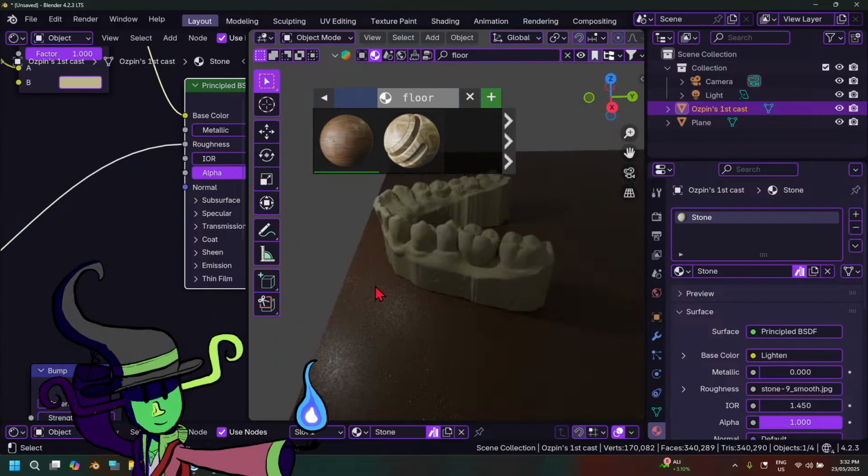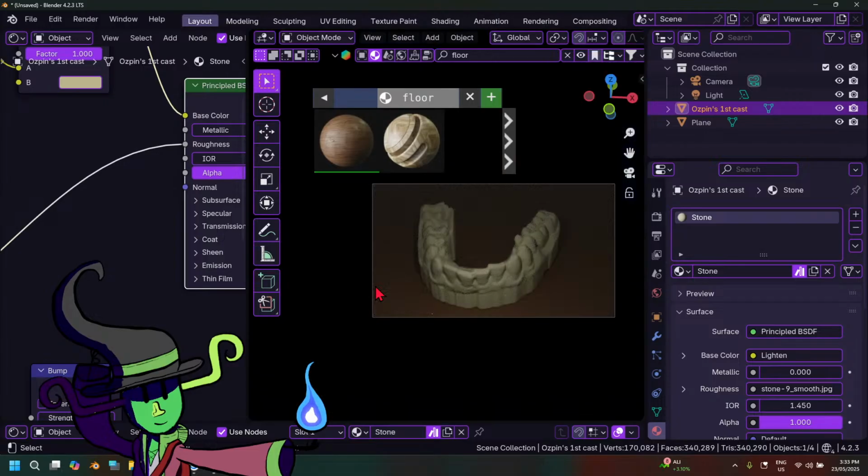And if your patient is like, oh, I'm not sure about this CAD procedure you're selling me, you can import your models into Blender, add a material to it, take a snapshot of it, and sell it to your patient, saying, hey, this is the final product of your procedure once we are all done with it. And they'll go, oh yeah, that looks pretty nice, I want to have that.